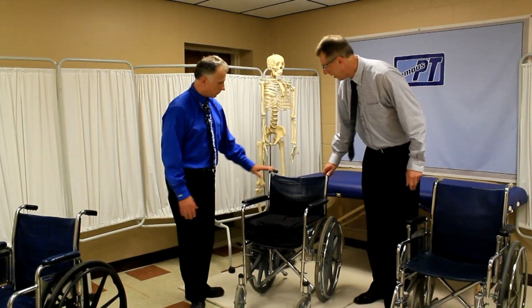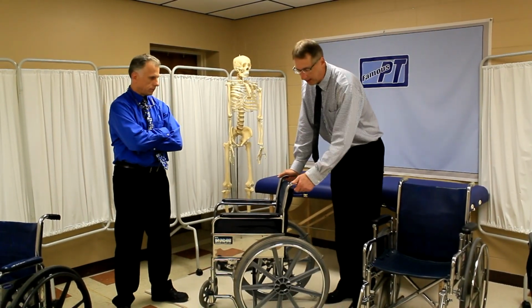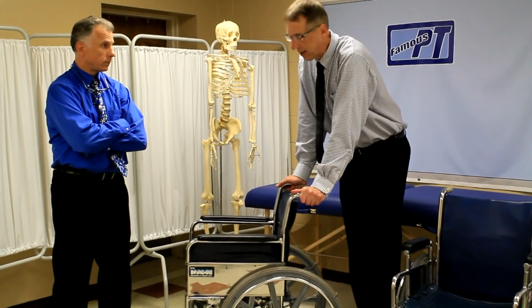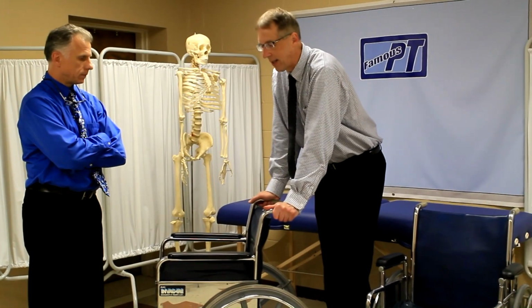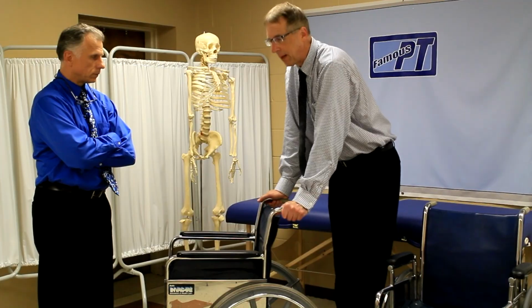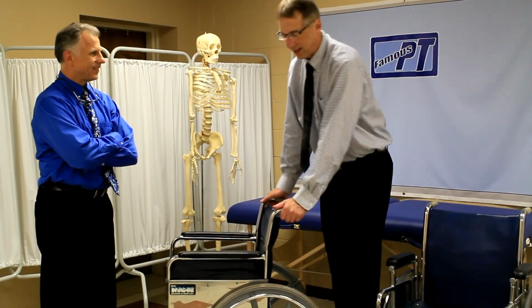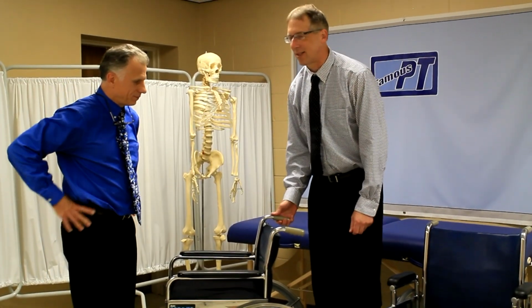Handles on the chair, for most people, they're going to want the handles on the chair. I've heard of some, these are higher end ones, that actually fold down. And you say, why wouldn't you want those on there? If you're in your chair all the time, there's people that don't want you to push them. And the other thing, one lady that I saw on the internet, she was talking, she says when people come up and talk to her, they put their hands on there and shake her chair while she's talking, and it drives her crazy.